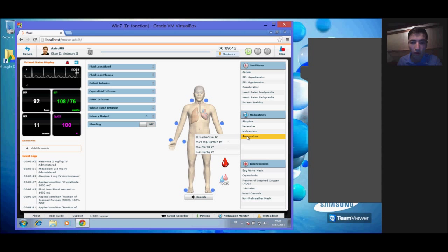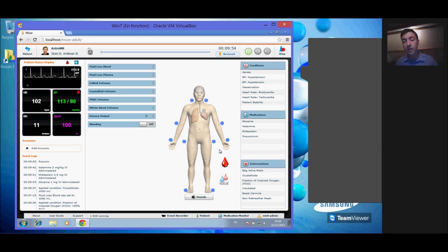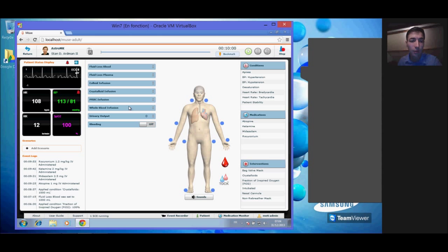And then the muscle blocker. So on the Muse software, but in parallel, you're gonna have to inject it to the mannequin, or to pretend to inject it to the mannequin using the 4 syringes that you had ready.